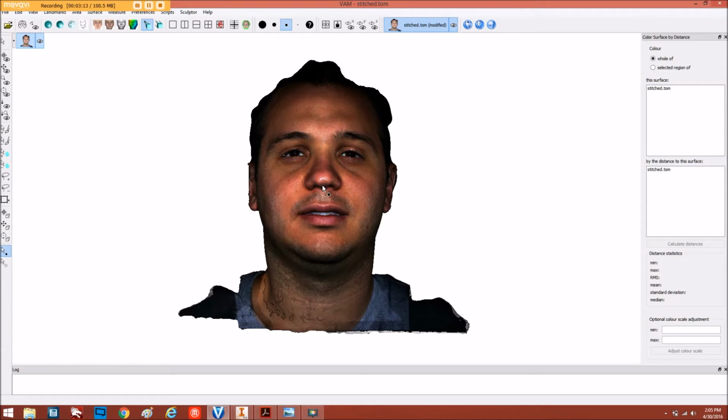Basically, I'm going to put landmarks all over the midline, landmarks that I'm going to use to measure distance across surface. That way I actually get not only the XY but also the Z. So you get the interior surface, but you also get the projection on the back on your distance.